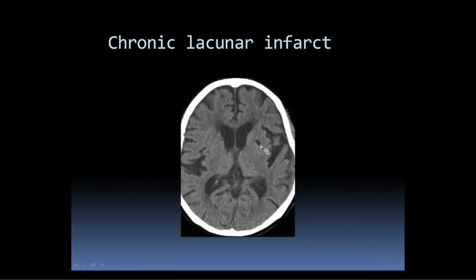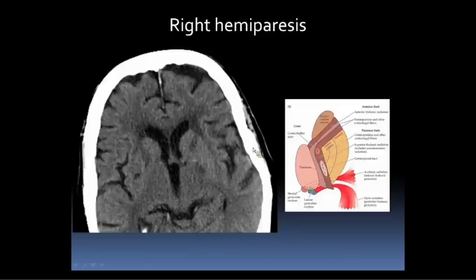So it's difficult sometimes to age things on CT as opposed to MR. However, when you have something approaching CSF density, you can be pretty confident that it's a chronic infarct, even when it's small like this. Really, the differentiator here becomes: it's clearly not something that we can call chronic, but is it an acute infarct, or is it some of this just chronic small vessel ischemic change? So that sometimes becomes difficult.